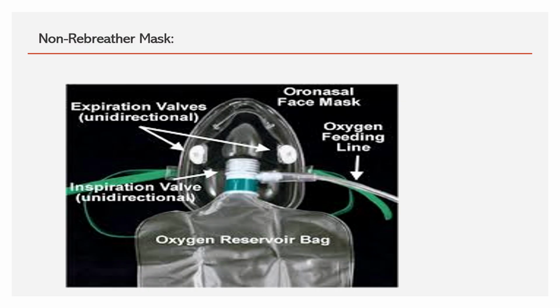Here is a clear picture of the non-rebreathe mask. You can see the valves on both sides of the mask, and inside also there is a valve. This is the bag, this is the face mask, and this is the connection to the oxygen.